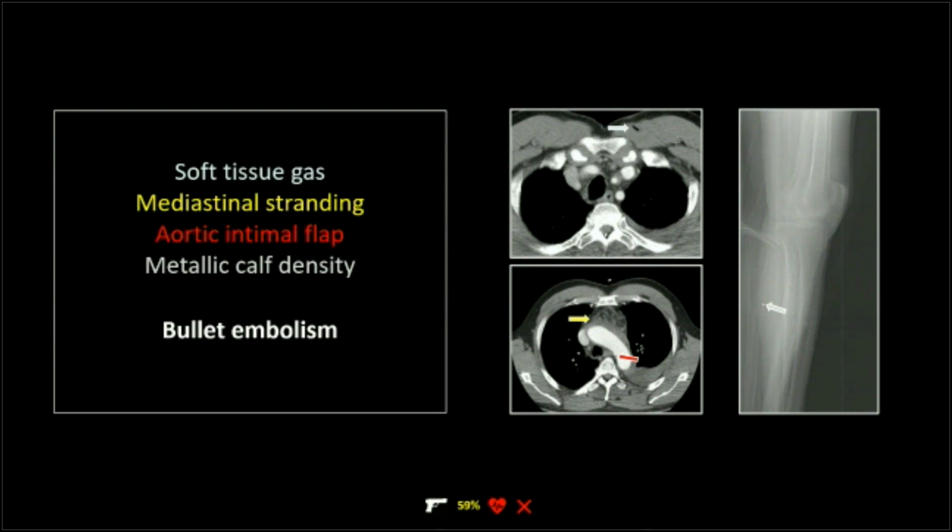Oh yeah, they definitely are involved. You can actually see, in fact, I remember looking at this case as I scrolled down, I said, there's density around the carotids, and it actually caught my eye. It was the first thing that caught my eye on this case when I looked at it.